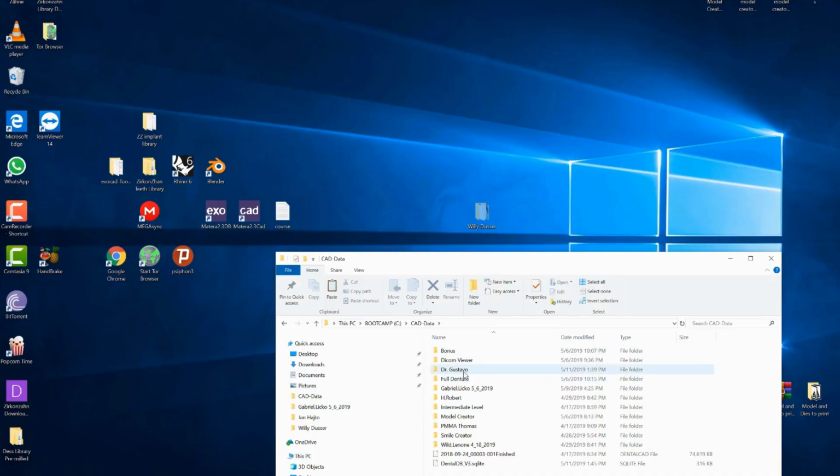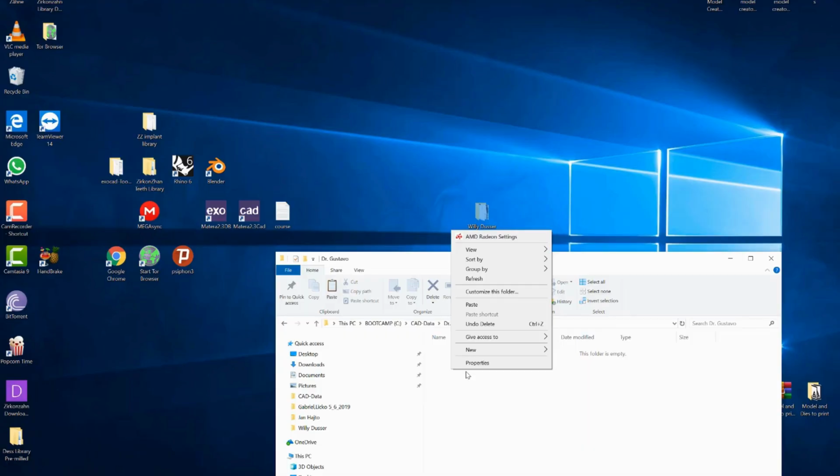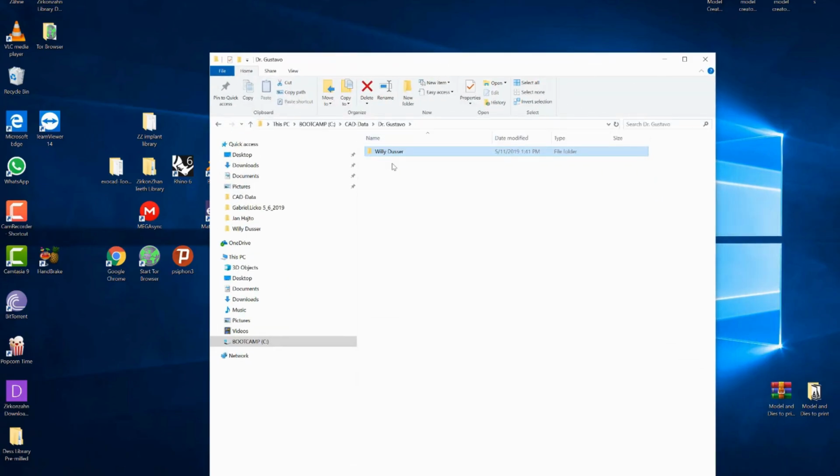And the doctor is Dr. Gustavo. So I'm just going to click on Dr. Gustavo, and into the Dr. Gustavo folder, I'm going to paste the Willie Dusser folder, okay? Right here. So everything is well organized.